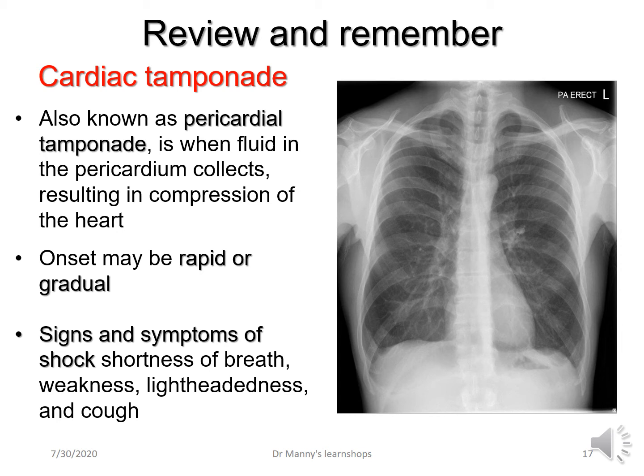Cardiac tamponade is a life-threatening condition, and it can also be known as pericardial tamponade. Tamponade, as in tampon, means to compress, to cause pressure.